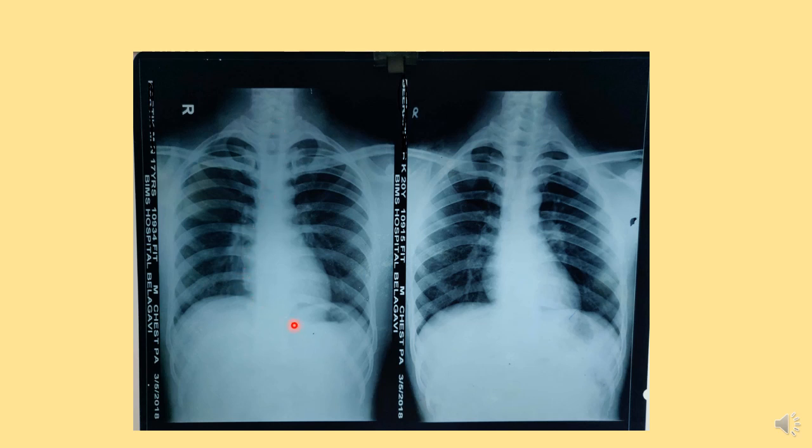And this is the cardiac shadow. This is the liver shadow, and these are abdominal organs. On the right side, it is much higher because the dome is higher. The cupola of the diaphragm is much higher on the right side, and on the left side, this is the dome of the diaphragm. Below the dome of the diaphragm, you can appreciate here the gas shadow. This is fundic gas. Here also you can see this is fundic gas, black shadow. Below the dome of the diaphragm, there is some gas in the abdomen. This is gas in the fundus of the stomach.